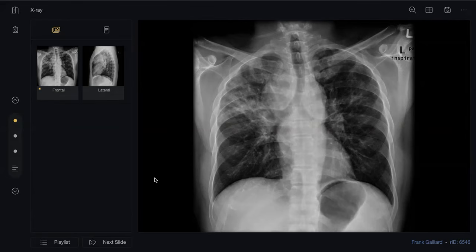Good. So if we think this is sarcoidosis, what stage is it? It is the involvement of the parenchyma and the lymph node, so it will be stage 3. Are you sure? How many stages are there? There are 5 stages. Just tell me what the stages are. In the first one, there is only lymphadenopathy. In the second, it's the lung and lymphadenopathy. First is stage 0. Yes, first is 0. Now you got it.